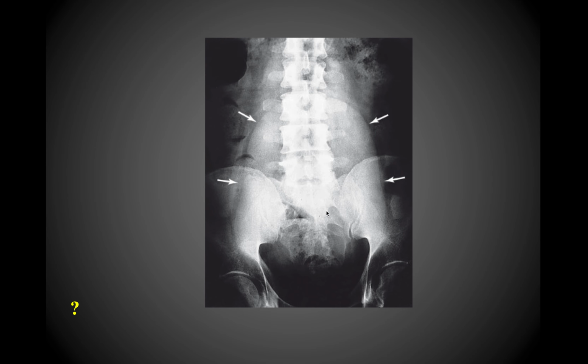Especially in patients in nursing homes, oftentimes you'll see these large bladder stones that form. It's pretty rare for folks who are mobile and able to get around without much issue to develop bladder stones. It certainly can happen, but it is relatively rare.